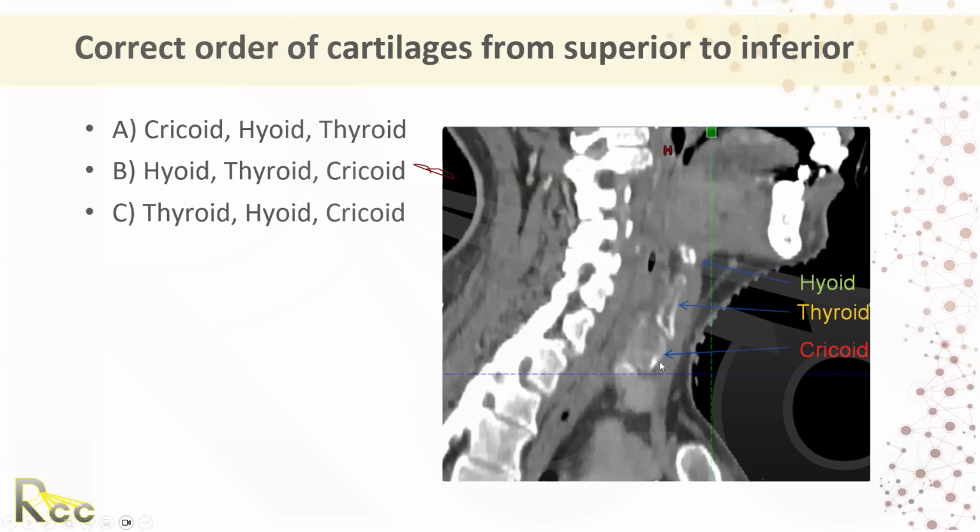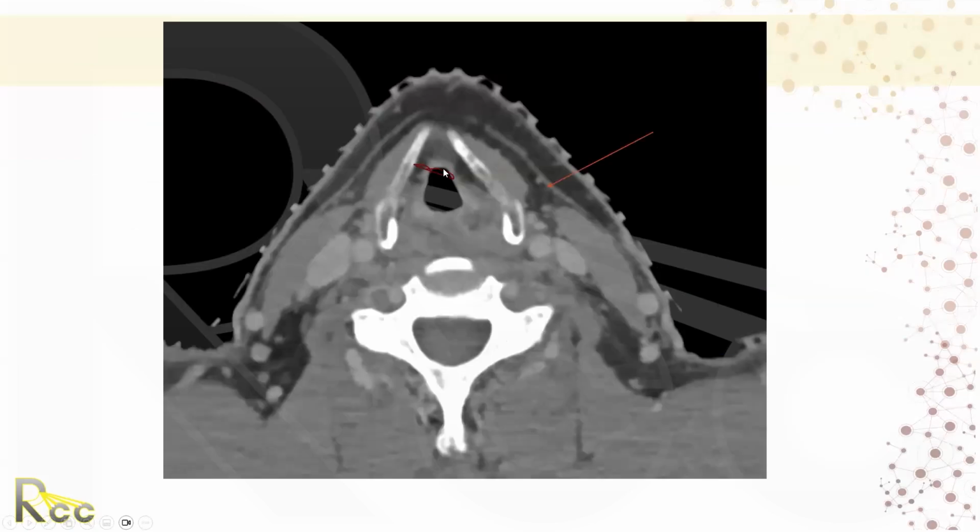So many have probably seen a sagittal diagram with the hyoid, thyroid cartilage, and cricoid cartilage. Now if we're looking at the anterior border, this is the anterior edge of the sternocleidomastoid muscle. And this is the thyrohyoid muscle, right? That's where I said the posterior third. So this space is important, and this is the anterior border.